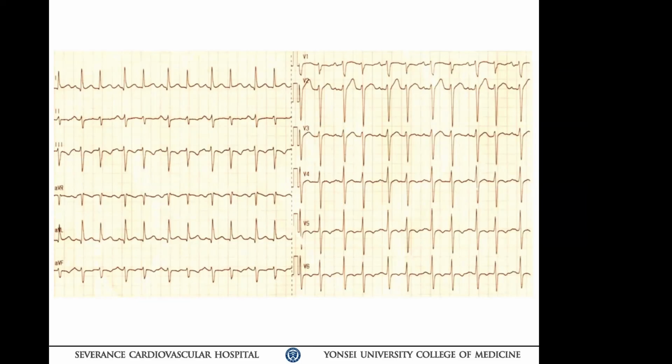So the puzzle of this question is you have a bigeminal pattern going on. The first visible P wave is quite abnormal. It's wide and tall, so you have to assume this patient has probably some atrial disease, maybe atrial enlargement. But if you look at the coupling of the bigeminy, they vary.